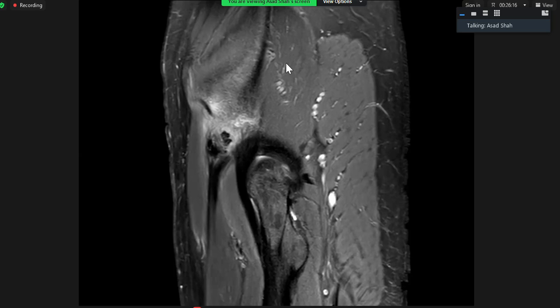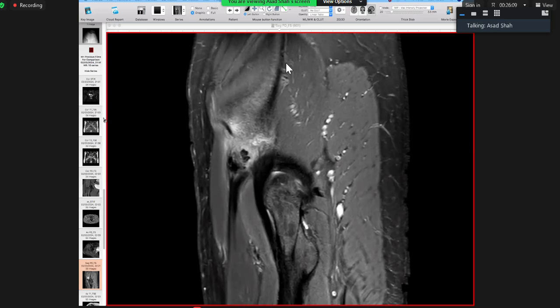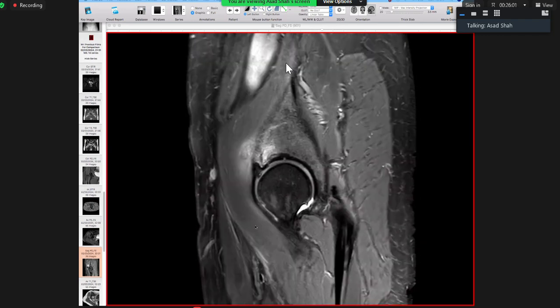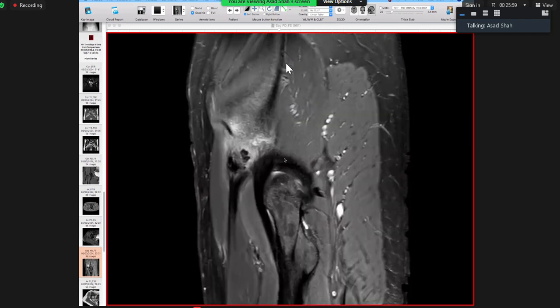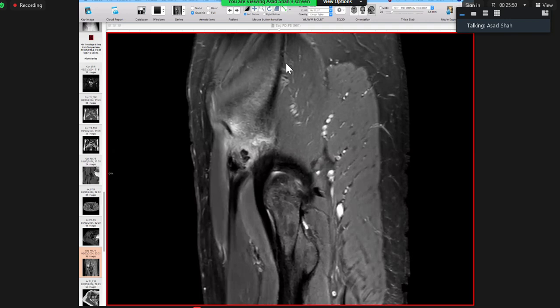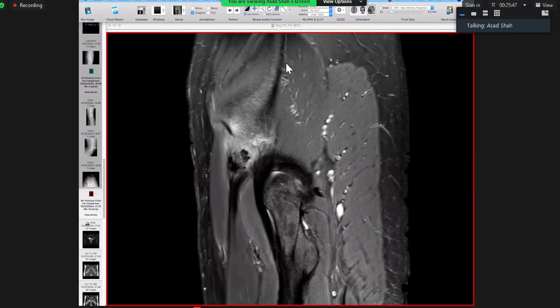All right. Okay. So I'm going to put the CT up for you. We said that if you see marrow edema, always think, is there a lesion in the bone, especially if there's a joint effusion, think about is there an osteoid osteoma or anything like that. But this one is not in the joint. There's no joint effusion. It's all anterior to that. There is all this altered signal in the soft tissues, and the big tendon attaches there. So obviously, avulsion injury will be in the differential.